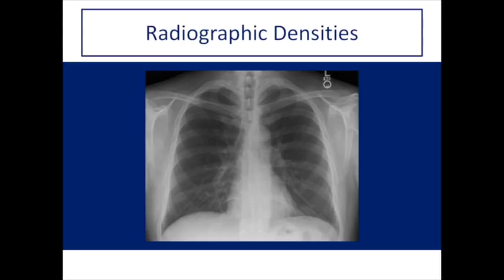So we start here with an X-ray image. The main point here is that to create an X-ray image, an X-ray beam is emitted through something. In this case, it happens to be someone's chest, and then it's detected on the other side. How black or white an area on the film is depends on the density of the tissues between the emitter and the detector at that point.